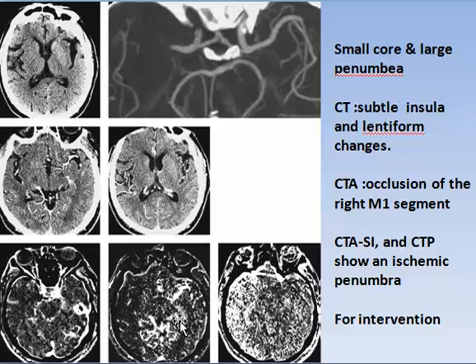So it is an extensive penumbra. This needs intervention. The core is small, while the affected part is very big.